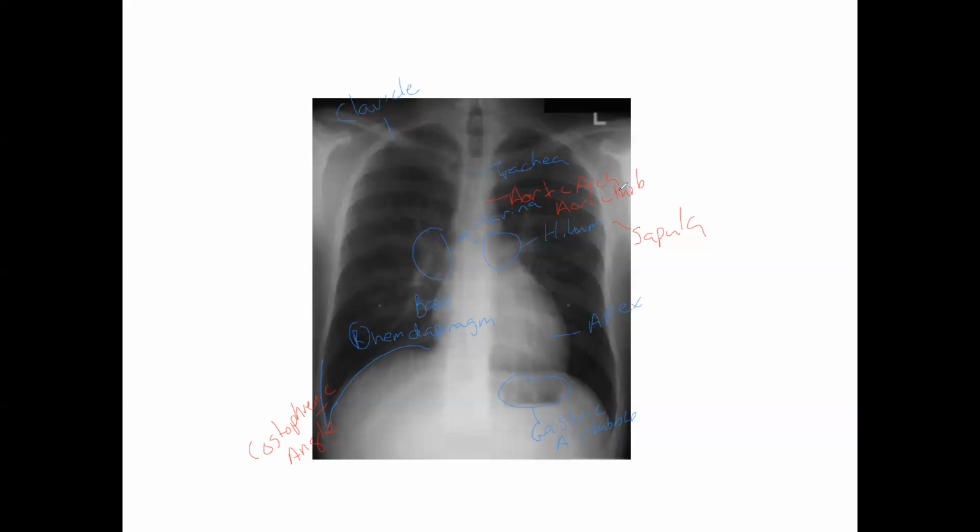I do recommend, if you're working in the intensive care unit, ICUs, to make sure that you are looking at your chest x-rays on a daily basis of those individuals, especially those that have an artificial airway, because you want to make sure that the artificial airway is in good position, and also make sure there's not been a significant change as far as radiographic images are concerned based upon the care that you gave. And then we'll also finish it up with 12 ribs on each side.